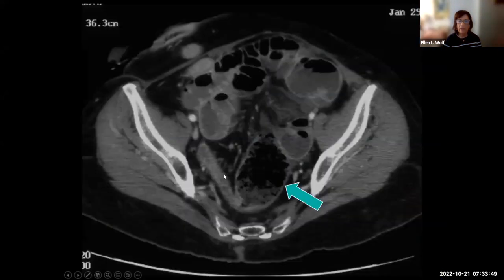This is a case illustrating the small bowel feces sign, where we can see this bubbly particulate matter within this dilated loop of small bowel. Again, we see transition to decompressed small bowel. At this point, there was an adhesion. And this small bowel feces sign tends to occur right at the point of transition between the dilated and non-dilated bowel, so it is a marker for small bowel obstruction. If you see this sign, you should look right distal to that to see what the point of obstruction is. So that's the small bowel feces sign.